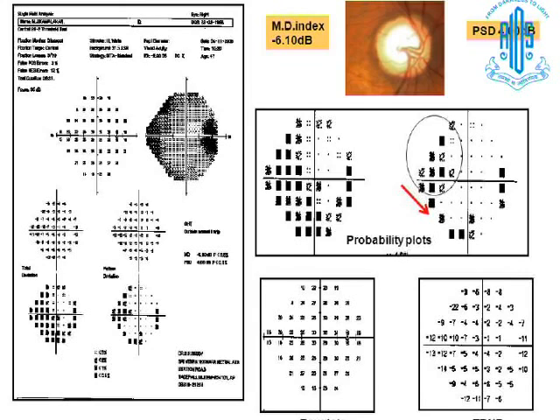So the patient may still have 25 dB sensitivity and it is still a black square. A black square is not an absolute scotoma. So from this you decide this is not a severe glaucoma, and your treatment need not be very aggressive.